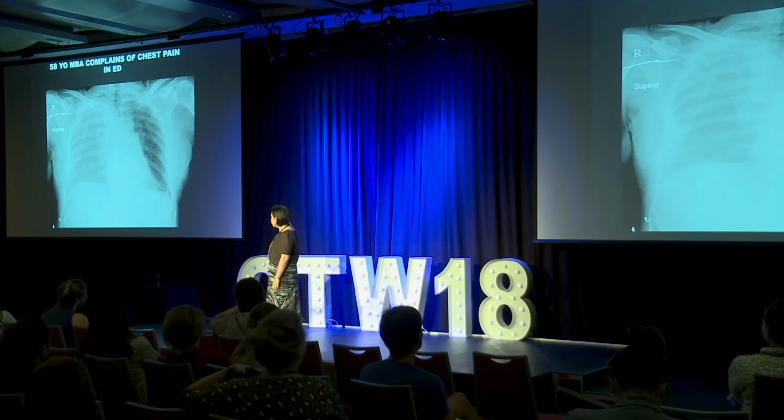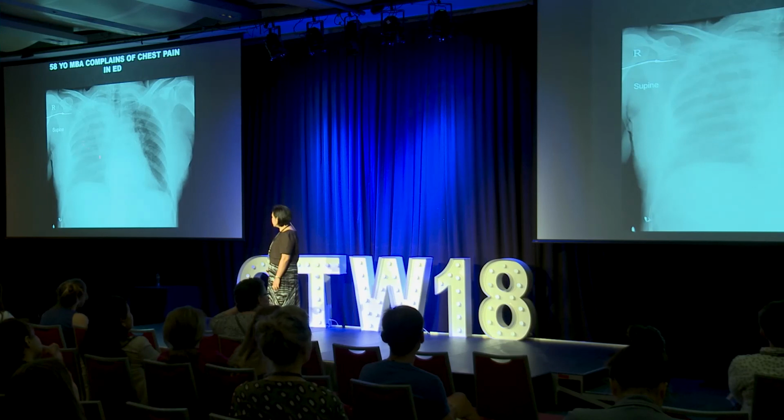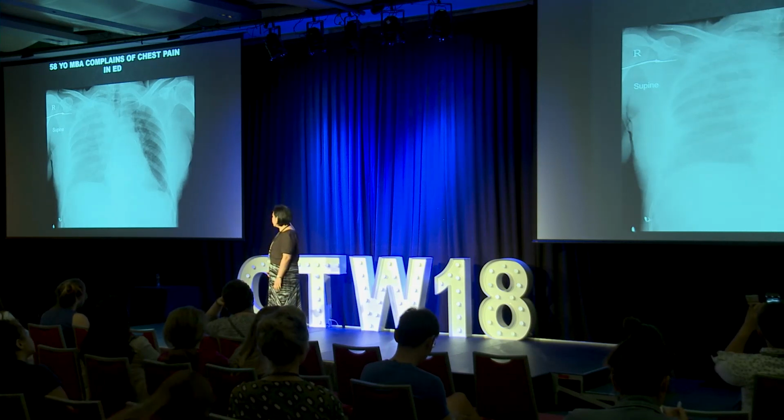Even if you don't see any rib fractures, in any trauma case. I mean, if it's not a trauma case, it could just be normal, simple pleural fluid. I mean, you don't know on a chest X-ray whether it's simple fluid or blood or pus. But certainly in this kind of scenario, you'll be worried about hemothorax. You'll probably go on to do a CT to make sure you don't miss any other injuries. Okay.